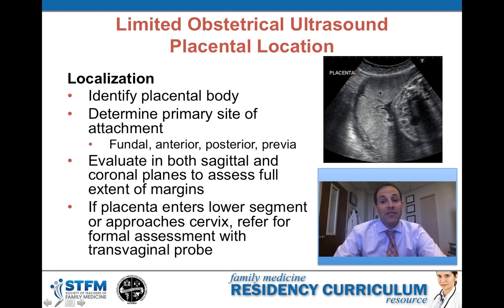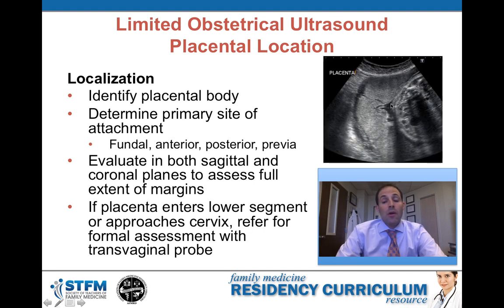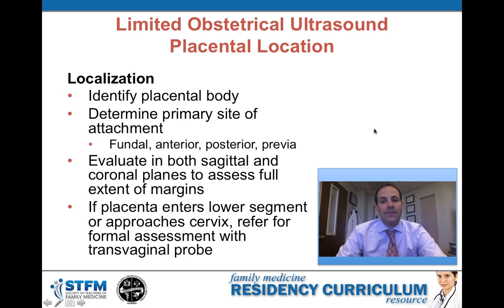This is an example of a fundal placenta. While you cannot see the entire uterus in this view, this round portion on the left of this image represents the fundus, with the placenta attached right in the mid portion of the uterine fundus.